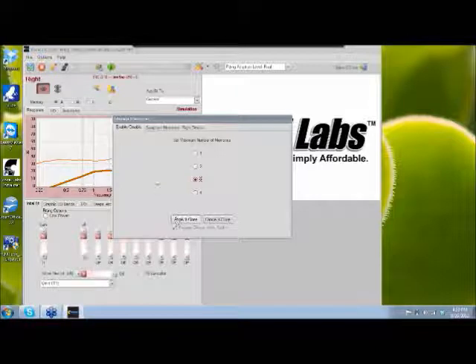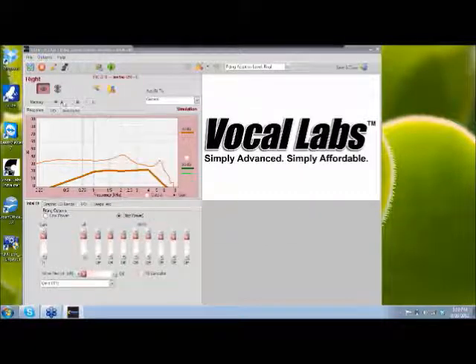If you click apply and close, what you've done in here is going to be applied. You'll see up here swap to memories. You can also copy memories and restore memories. If I had a device connected and I was working with a patient that I had used before, I had saved a session, this is where I could restore those sessions. Those would be up in here. So at this point, we're just trying to pick our number of memories, though. So I pick 3 memories, and I click apply and close. I have my 3 memories here.